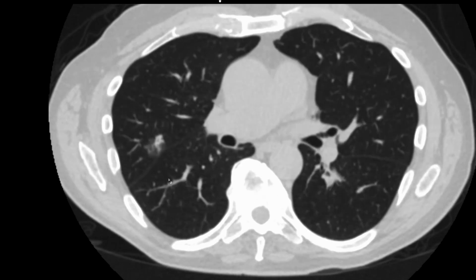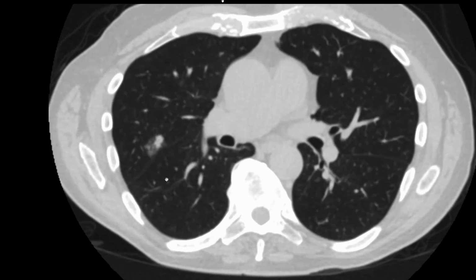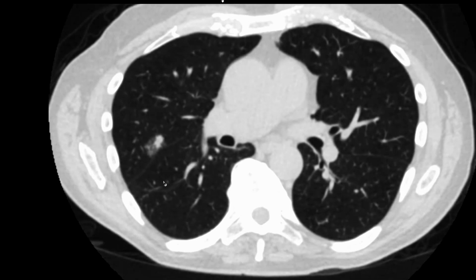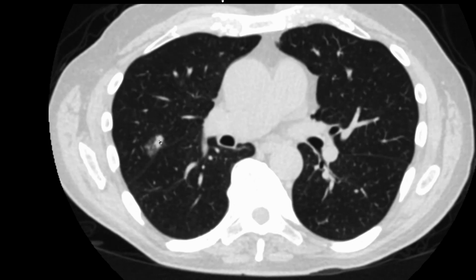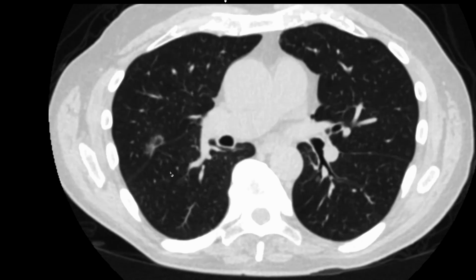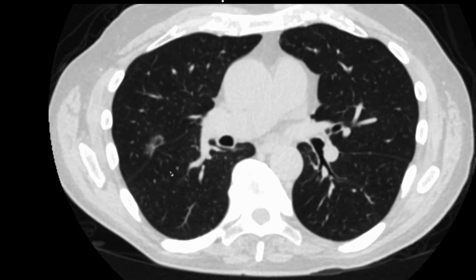the other findings that have been described, this doesn't have it, is sometimes you'll see little notches in them, which have been associated with them being adenocarcinomas. Notches in the nodule, like little clefts in it, where it's like an indentation or something. Like right there, if you look on your solid component, there's a little indentation at about 3 o'clock. Yeah, sort of this lobulated thing. But these are super nice teaching cases for the so-called part solid nodule, and how they might evolve over time.